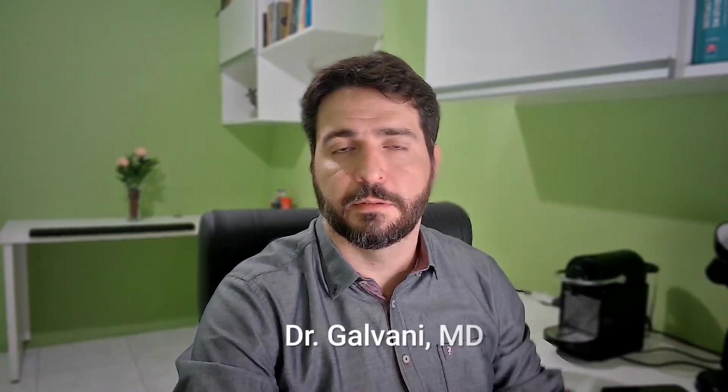Hi, hello everyone. So let's grab a CT scan from the emergency to read, because as you guys know, CT scans just won't report themselves. So this is a 55-year-old male patient, and this is a pulmonary artery angiogram because it says this patient might just have an acute thrombosis.